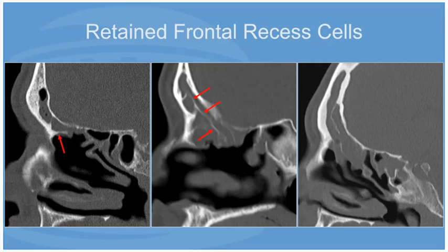In the middle case, we can see evidence of prior ethmoidectomy with residual opacification of the frontal sinus. Hopefully you can see the large opacified supra-agger frontal, or type 3 cell, extending into the frontal sinus, its ostium, and frontal recess. In addition, along the posterior wall of the frontal recess, we can see another strut of bone representing the residual anterior wall of a suprabulla cell.